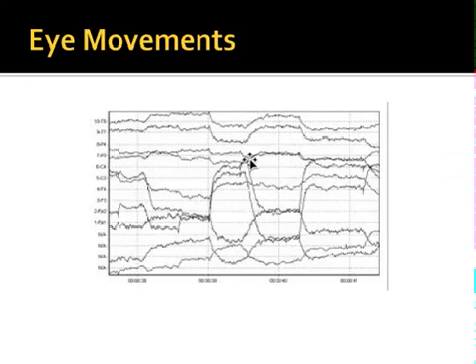Here's an example of an eye movement. You can see here in the background normal EEG, and then you almost see these plateau-like steps, and then EEG continues stepping down, EEG continues stepping up, EEG continues. So these lower frequency, almost square wave looking kinds of things, those are vertical and horizontal eye movements.